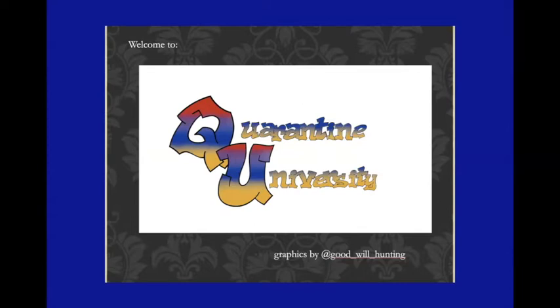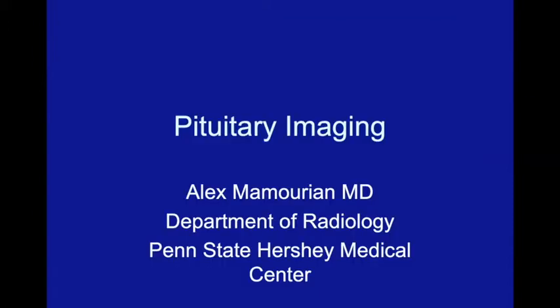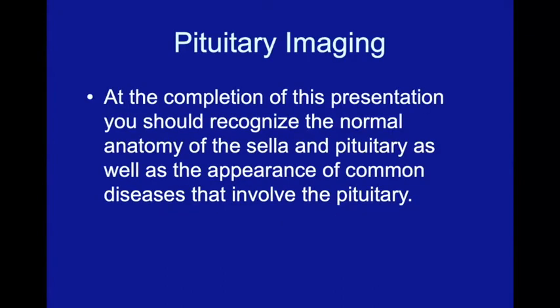I'm following on this theme of diseases specific to parts of the brain. And today we're going to talk about the pituitary gland, since this is a common site of requests in clinical practice, and there are a lot of variations of normal. We'll review a lot of these today, and I'll try to give you some pearls that I've discovered in my own practice over the years.